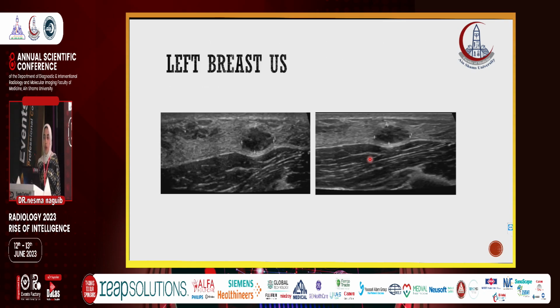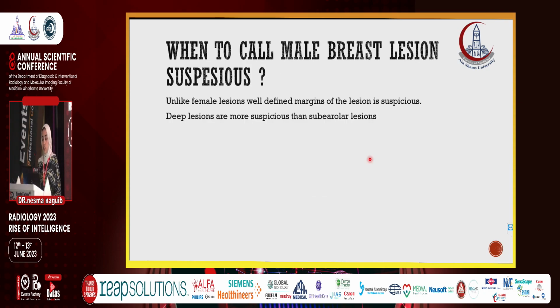This case is a fibrolipoma by pathology, okay? And just to put in your mind that a well-defined lesion is more suspicious in a male breast lump.